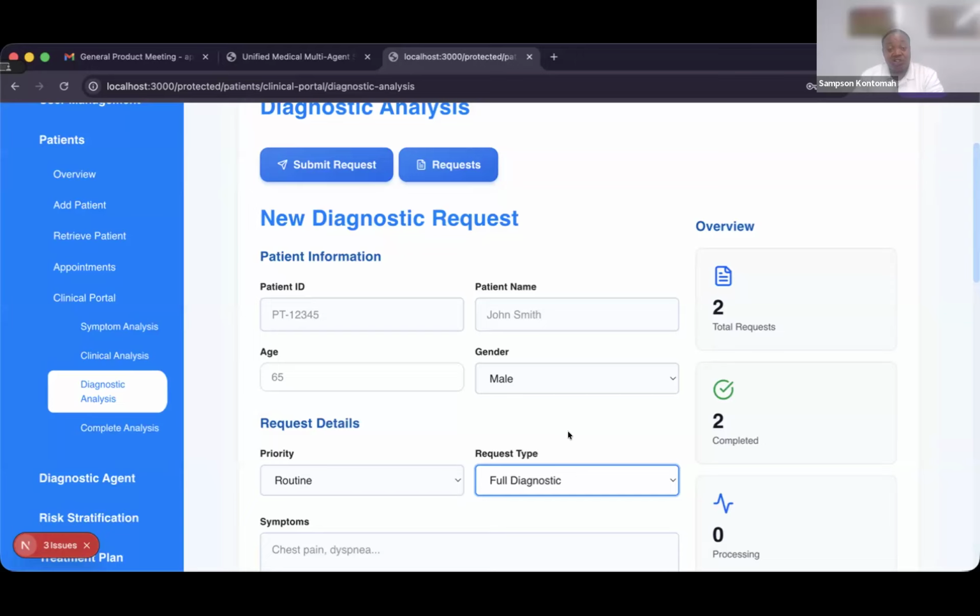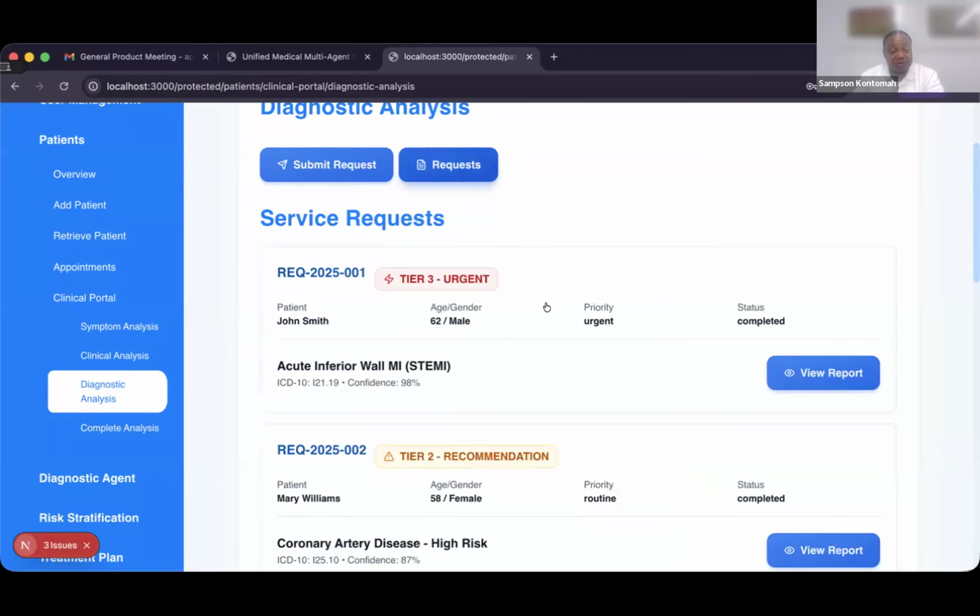We also have the automation policy that outlines the automation tiers, whether it is tier 3, tier 2, or tier 1. In some cases, based on the confidence level, it is going to be autonomous and need urgent action. In some cases, if it is semi-autonomous, that requires cardiology or physician review and approval before any action can be taken. If the confidence level is very low, it's purely informational or educational. So let's go to the use cases to see how it works.